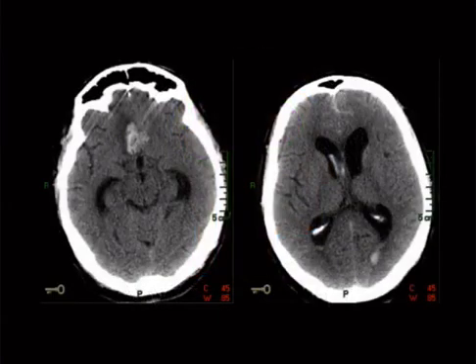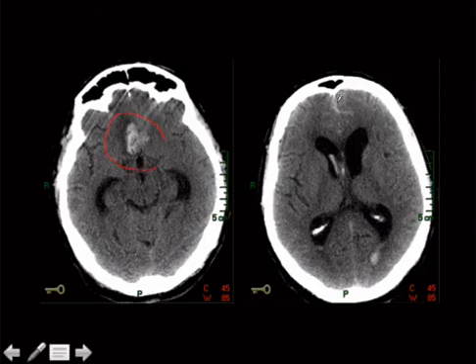we've got a non contrast axial CT, and we're at two different levels here, one through the ventricles and one a little bit lower down. And what we're seeing is some hemorrhage, right? Right through here, and a little bit more here, and a little bit here and here. So we've got some subarachnoid hemorrhage.